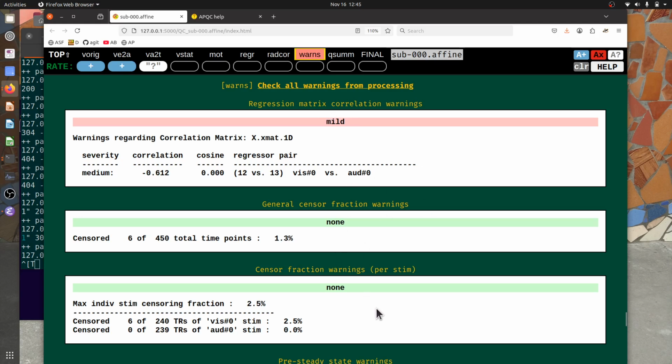and you'll see that we have a lot of subsections that are reporting on different things that have been checked. There's different levels of warning that go along with each one, from none to mild and higher. And what we do is we take the coloration in a couple different regards of the most severe warning here and put it up here.